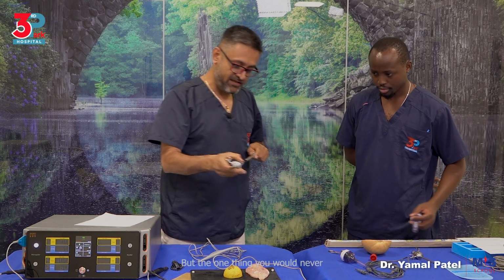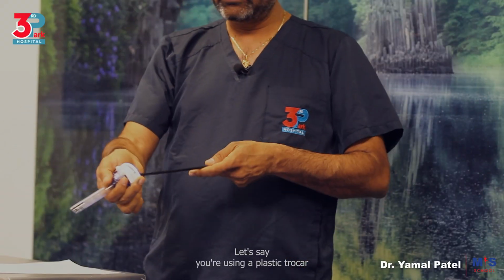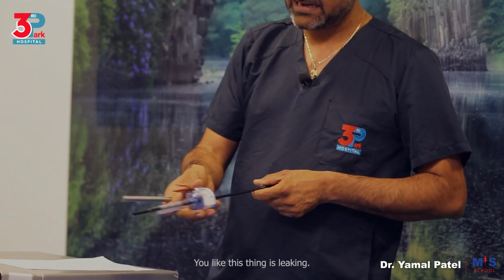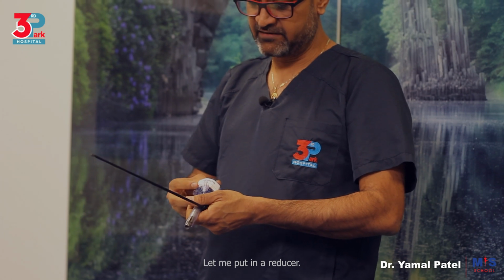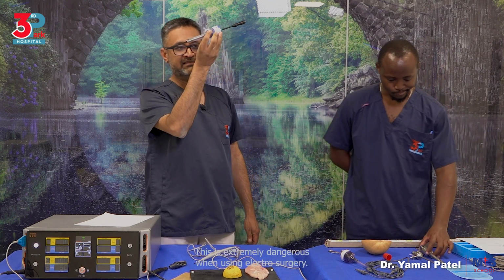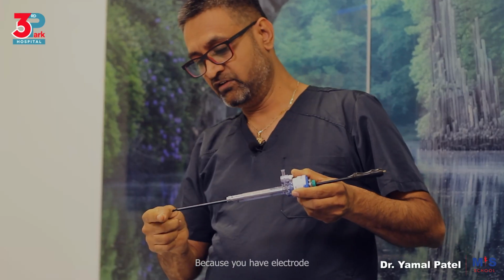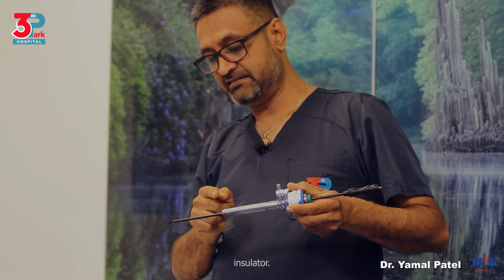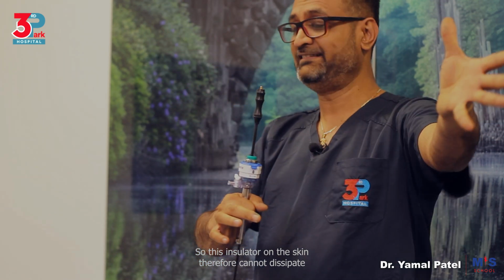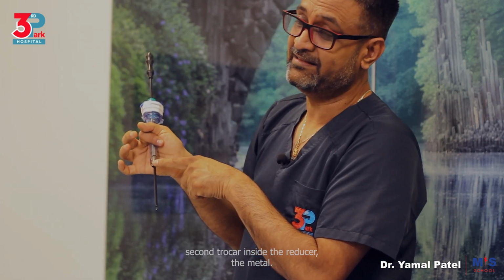But the one thing you would never do is make a hybrid trocar. So what is a hybrid trocar? Let's say you're using a plastic trocar, and this is leaking. So what do you do? You would think, this thing is leaking, it's making noise. Let me put in a reducer, a metal reducer, and you do this. Now this is a hybrid trocar. This is extremely dangerous when using electrosurgery. Why is it dangerous? Because you have electrode, insulator, electrode, insulator. So this insulator on the skin therefore cannot dissipate the electricity because it is an insulator. So where is the electricity collecting? On this second trocar inside, the reducer, the metal.